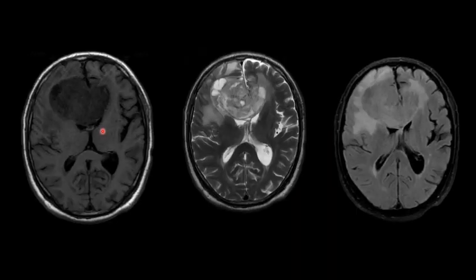This is an axial T1 weighted MR image showing a large heterogeneously hypointense lesion predominantly involving the white matter of the right frontal region, genu of corpus callosum, crossing the midline and extending into the white matter of the left frontal region. The lesion is causing mass effect in the form of effacement of bilateral frontal horns of lateral ventricles, and there is mild effacement of adjacent sulci noted on the right side.